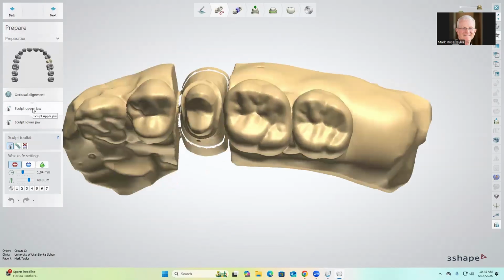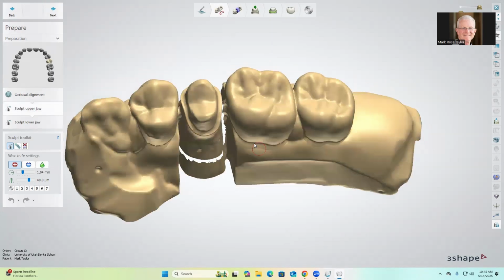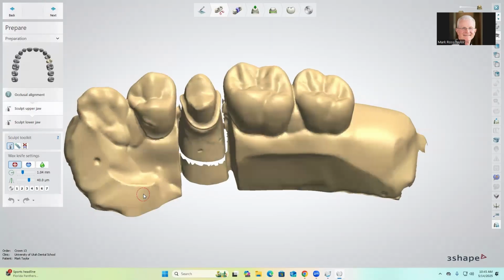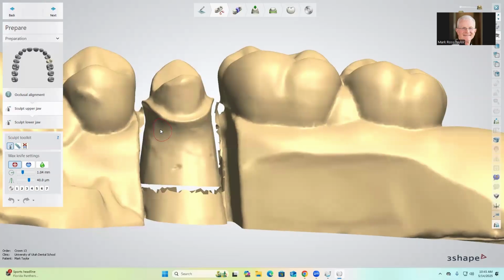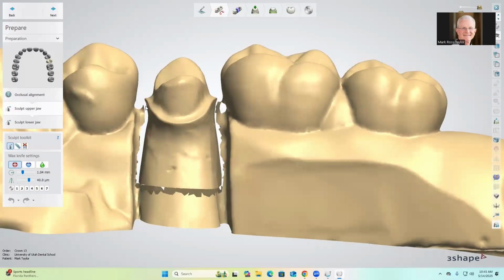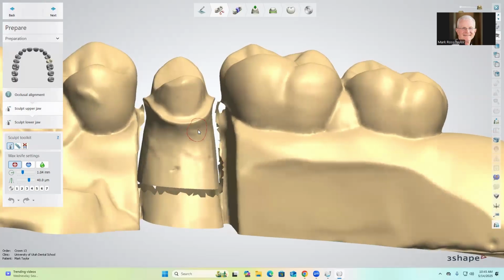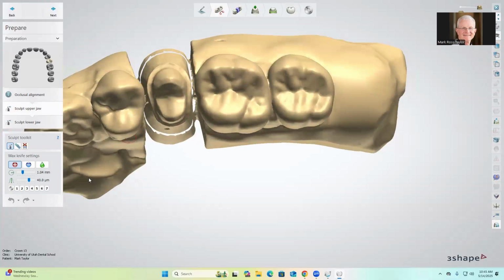So you can go into sculpt anatomy and all that, and all you're doing is getting rid of certain aspects of this. You don't really want to get rid of anything because it's been scanned and cleaned up. And you can even see here, remember where I said you scan the individual die? You can see how it's separated the die from the adjacent tooth. It's separated everything and made it nice and clean without that attachment point. So all we're going to do is go into next again.